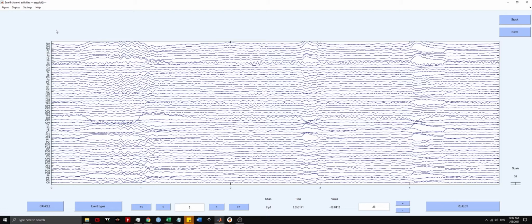So interpolating basically means to get rid of the data on that channel and replace it with data that's reconstructed from the surrounding electrodes. So an important thing to note here is that the interpolated electrode no longer contains unique information. So if you have a bad channel that's critical to your analysis, then you might want to consider excluding that participant instead of interpolating.